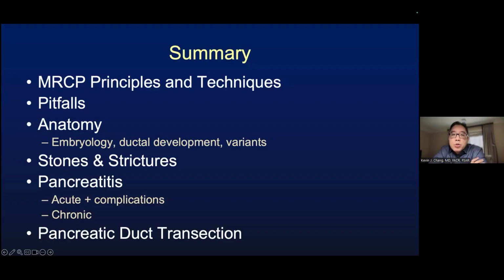The next question is, do pseudocysts communicate with the duct like an IPMN? And the answer is yes. When you see a cystic finding communicate with the duct, that narrows your differential down to two possibilities. One is an intraductal papillary mucinous neoplasm, and the other is pseudocyst. So in those cases, the differentiation can be made based off whether the patient is presenting with pancreatitis or not.